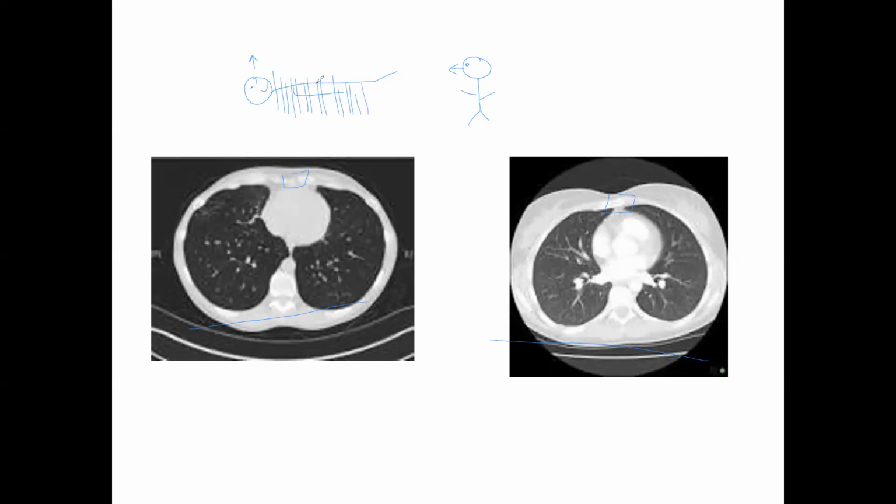So you're able to look at this particular slice of this particular portion of the chest and see what's going on. And you can actually move back and forth if you will. So you can also look at a head CT like that, as well as a chest CT. So we'll be able to look at that moving forward.